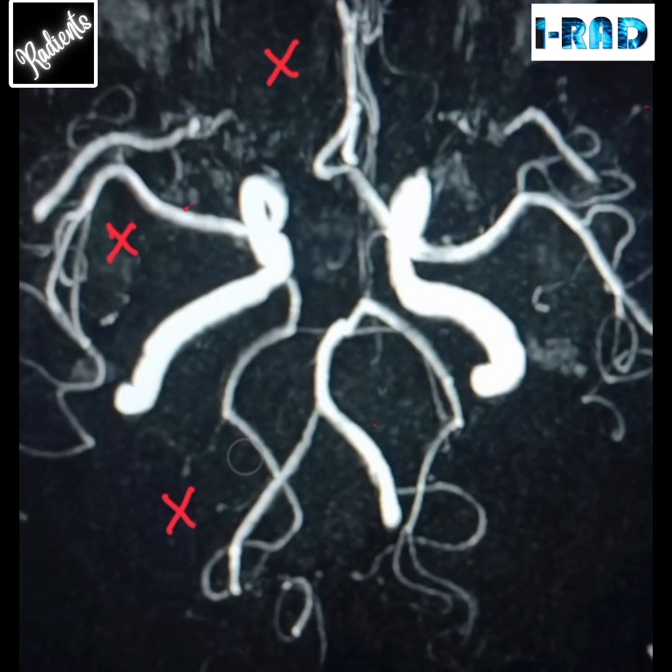There is, however, another advantage here. For example, if for any reason there is a blockage in the basilar artery, or in the PCA in the proximal part, provided that it is present here, anyway, for convenience, we will read this case as a blockage in the basilar artery.